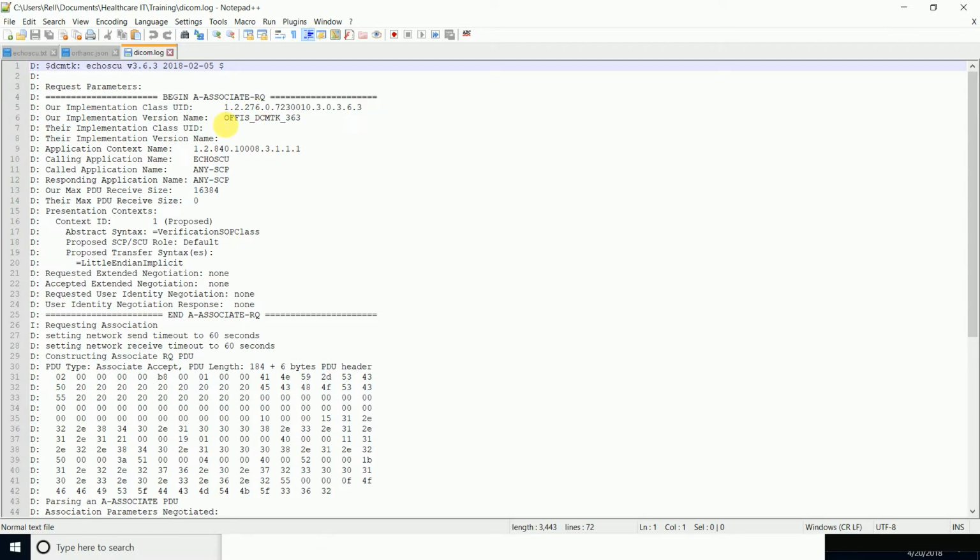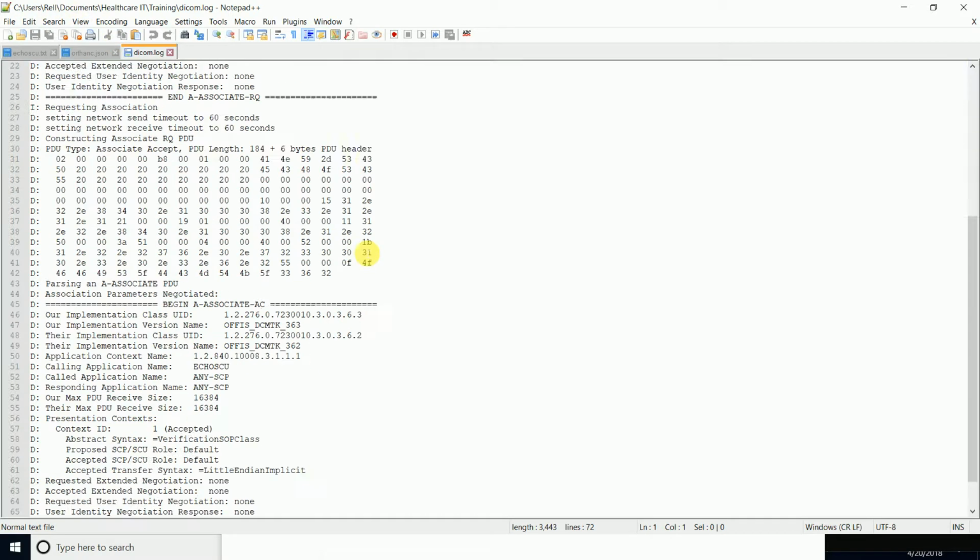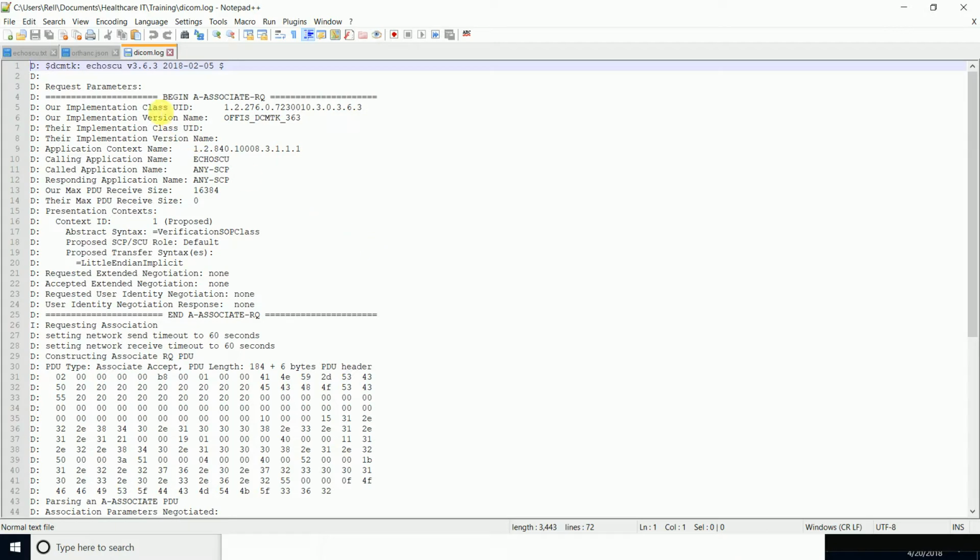Okay, let's take a look at what we have here. What good information we have here. We have the begin association request. We can see that, right? We have the calling application name.